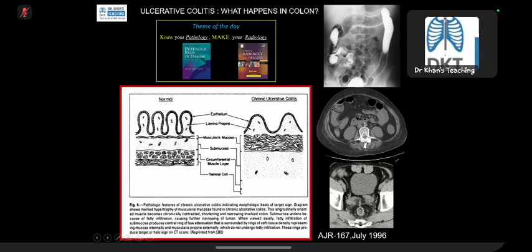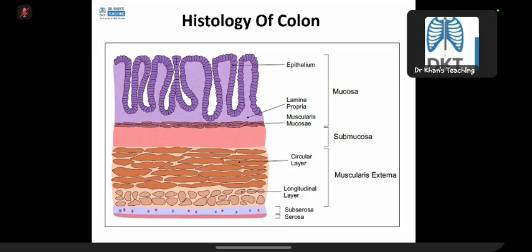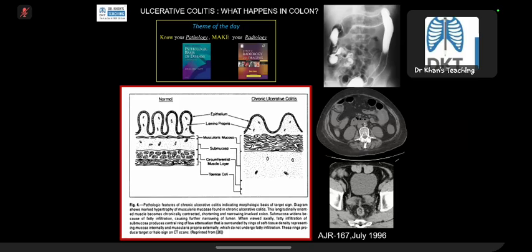And number two, if you see here, submucosa, look at this fat. Fat increases. Now, because it has lost, it becomes contracted. So these muscles are contracted, and that's why it's a lead pipe, featureless. It becomes smaller. It becomes like this, right? Lead pipe appearance.